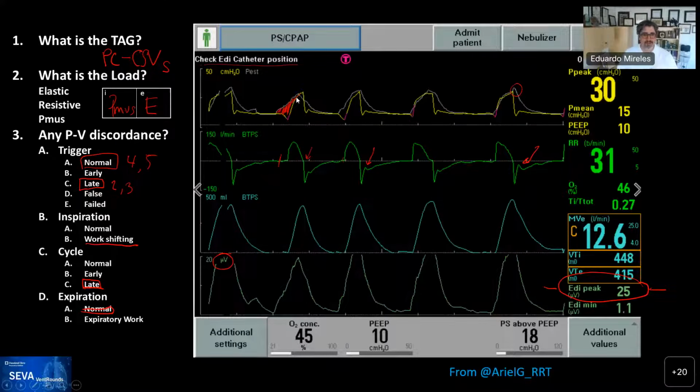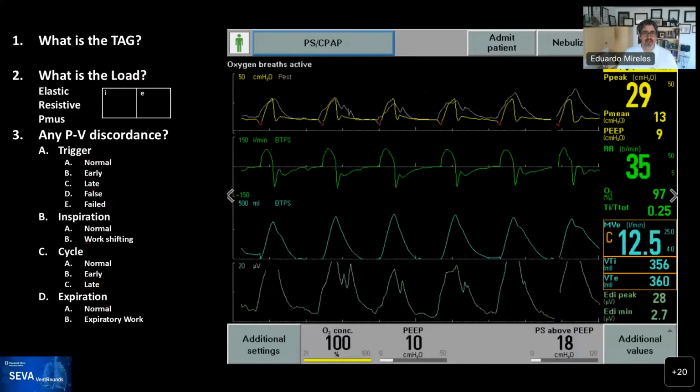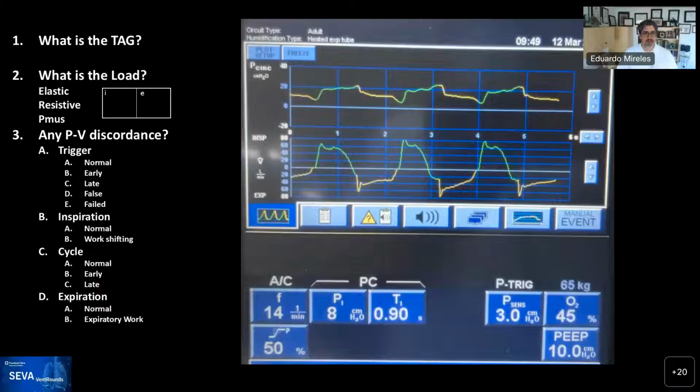The more signals we have, the more challenging it becomes to start reading these waveforms. That's a true statement, because you start seeing all these little details that you didn't see before. So in that sense, ignorance was bliss.